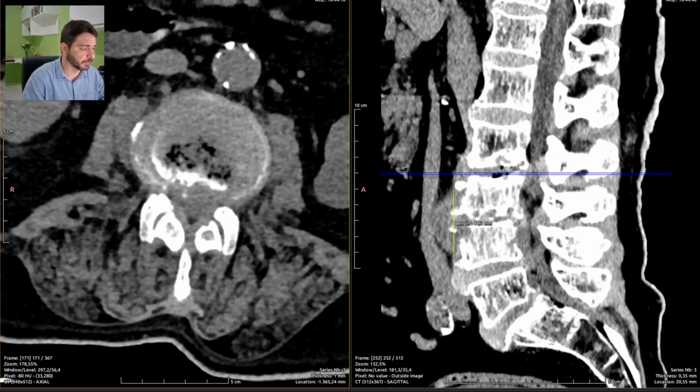Just reading what I just wrote. Make sure I didn't make a huge mistake. Now a footnote to suggest an MRI.